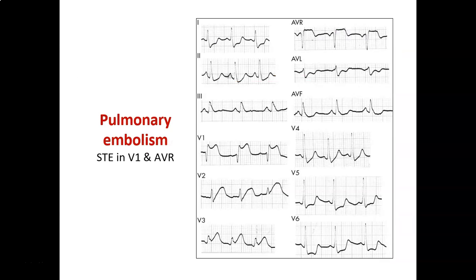If there is a history of recent trauma or recent surgery, and you get ST segment elevation in V1 and aVR, this may be a feature of pulmonary embolism.